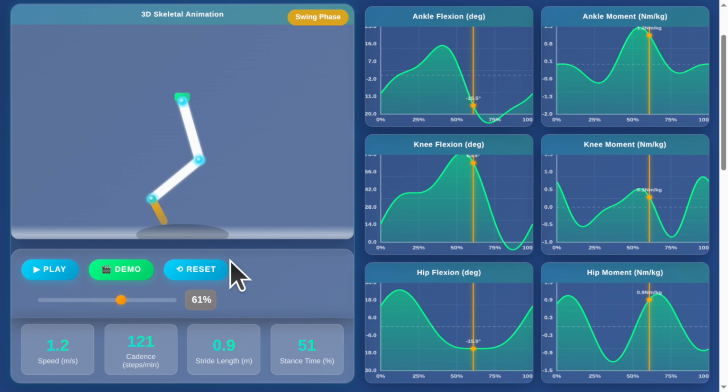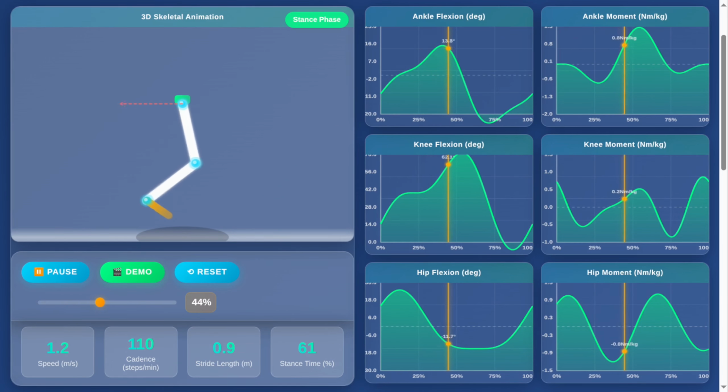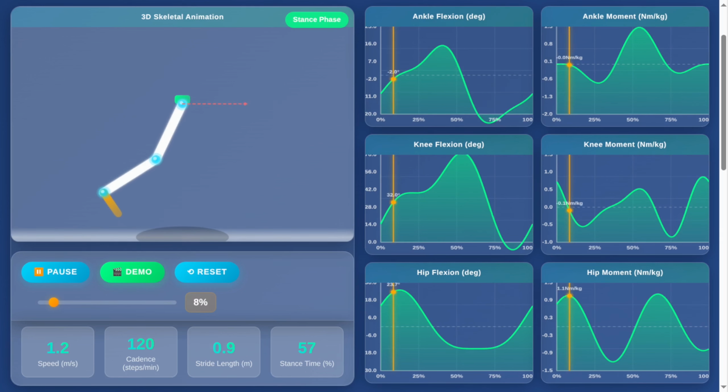Hey, can you just explain what you see on the screen very briefly, conversational style? You can make it fun if you like.